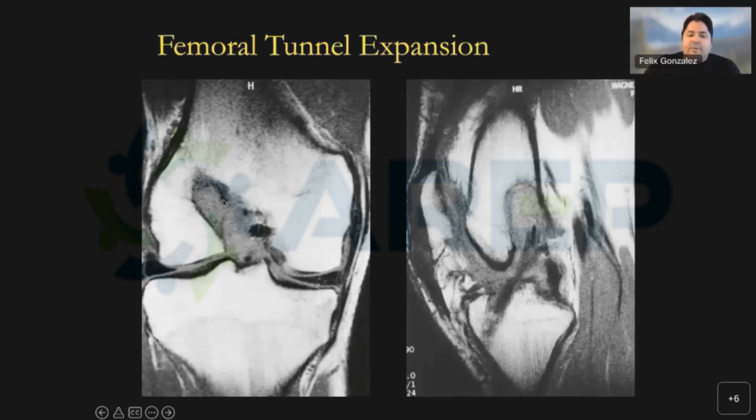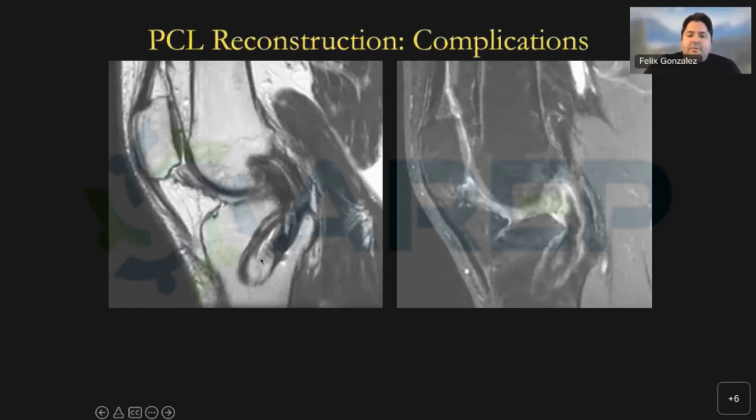Here's a femoral tunnel expansion, right? This is very large here. This is a tibial tunnel expansion in the setting of a PCL reconstruction complication.